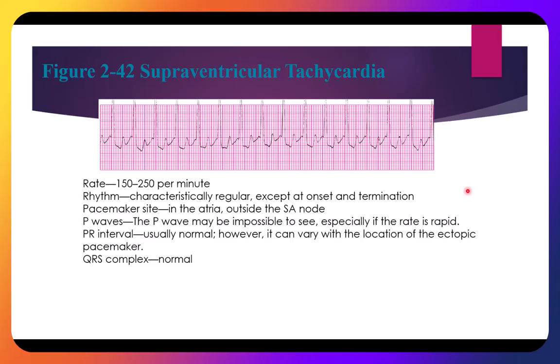So again, the only difference between PSVT, paroxysmal supraventricular tachycardia, and SVT, supraventricular tachycardia, is going to be the start and the stop.